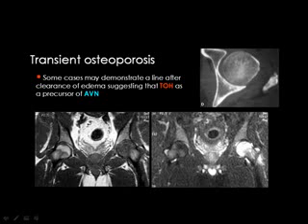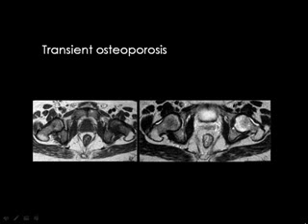Then, can you see migratory osteoporosis in the CT or the plain X-ray? You can hardly appreciate the degree of osteoporosis in these two conditions. But on MRI, you can see the femoral head and the neck affected by edema in the STIR image.